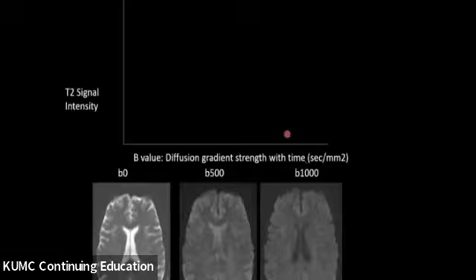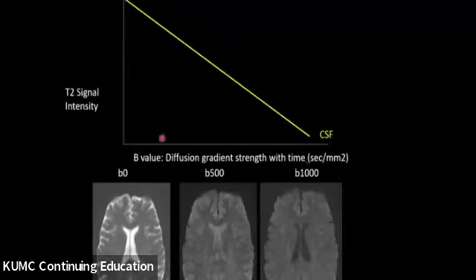And all you need to understand in terms of how this works, the important concept, is that with time on diffusion weighted imaging and proton diffusion, there is signal loss. So if we look at the CSF, as we know, it's going to be bright because of its high fluid content on the B0 starting point. But because, as we just looked at, it has the greatest diffusivity, it loses all of its signal. And on the B1000, it becomes the darkest thing, much darker than the normal brain.